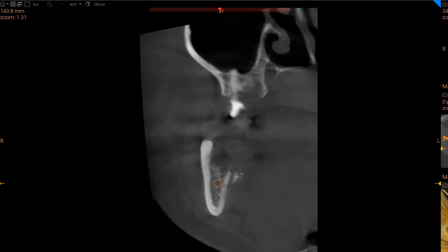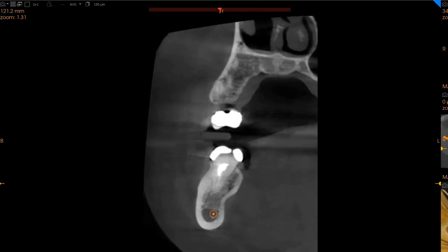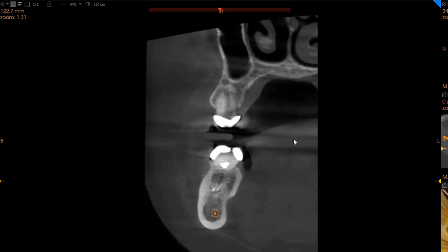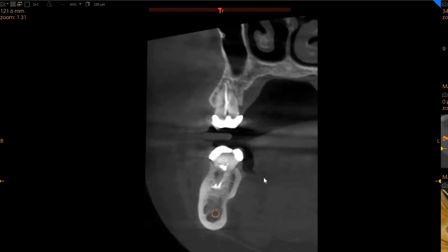The other thing the doctors asked is to see if there's anything else problematic. So we're going to go very superficially through everything. This is an endodontic treatment in the upper left five, second premolar. A little bit of periapical scarring, but no periapical radiolucencies can be seen. Very voidy root canal has been done.